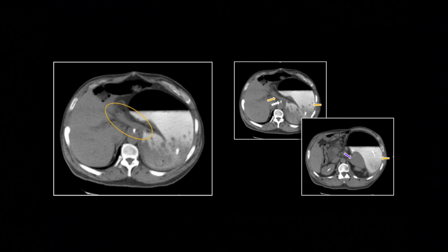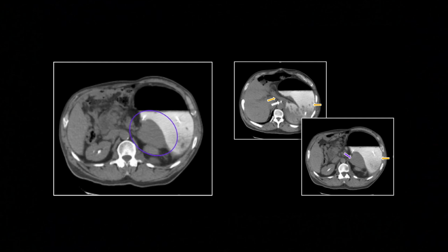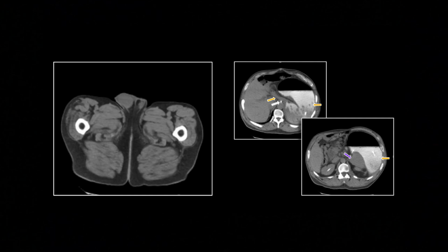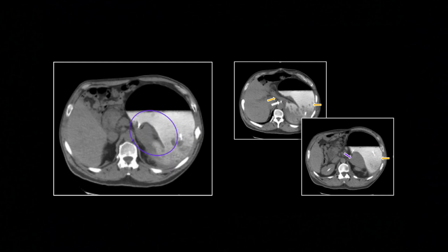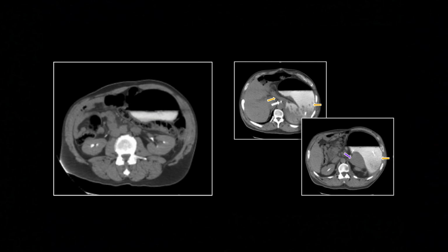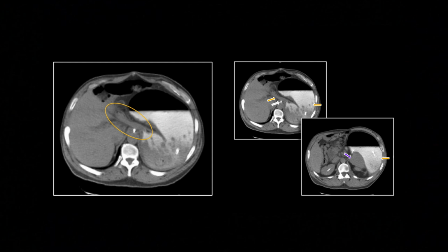So there is the pylorus and proximal duodenum, and then there's the GE junction. So the GE junction is below the level of the gastric outlet. Right? And that is the classic finding in mesenteroaxial gastric volvulus. And there is that spleen, which has been dragged by its association with the gastrosplenic ligament.